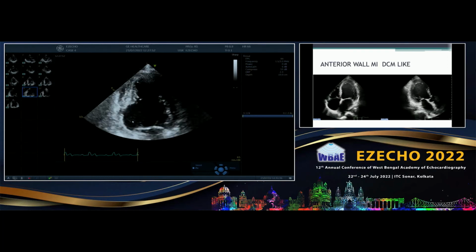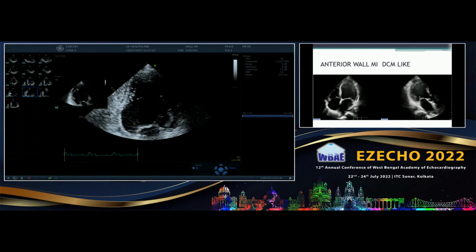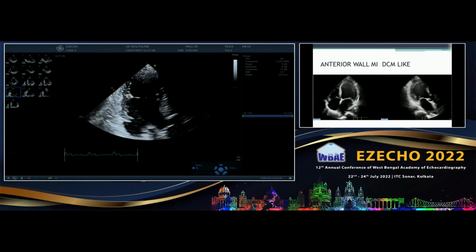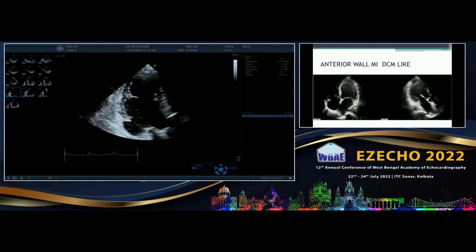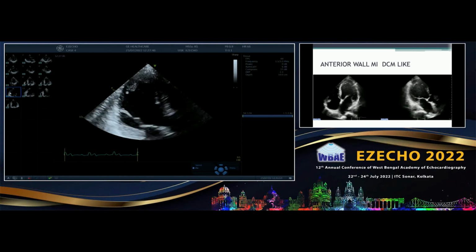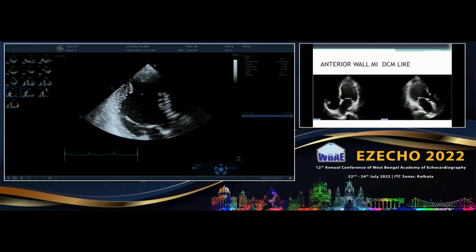Now look, go on the long axis view. Apical long axis view. Apical three chamber. Now here is the anterior septum and that entire thing is supplied by the LAD perforators. So the first septal perforator is here. So when this becomes akinetic, you know that is a pre-S1 stenosis, okay? When this is preserved and the rest is gone, this is a post-S1 LAD.